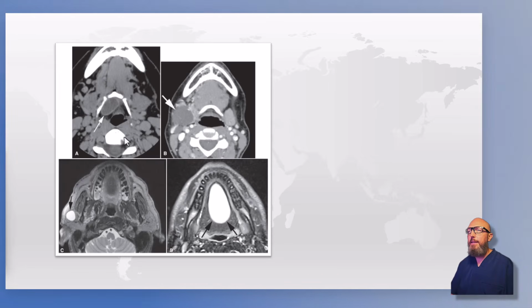Here's imaging of that. If you don't appreciate CTs yet, this is very low density, and you're probably not used to looking at these very bright things. This is a T2 MRI, and fluid appears very bright on T2 MRI, and that's telling you that these are definitely something filled with fluid. So think something cystic, and we just went over these cysts based on location.